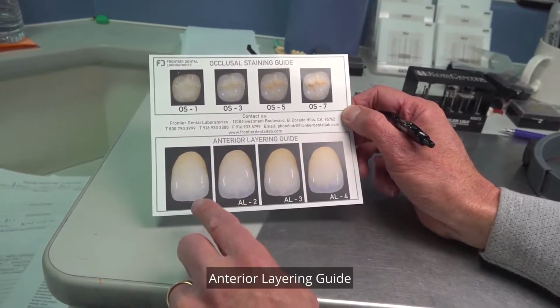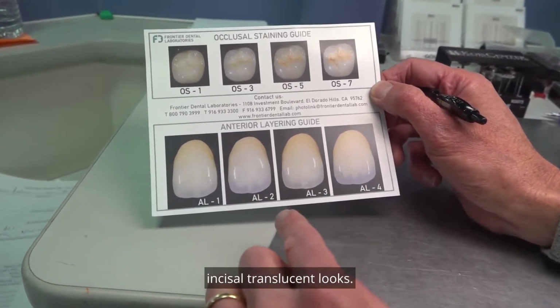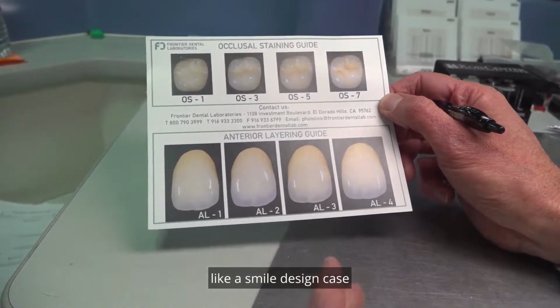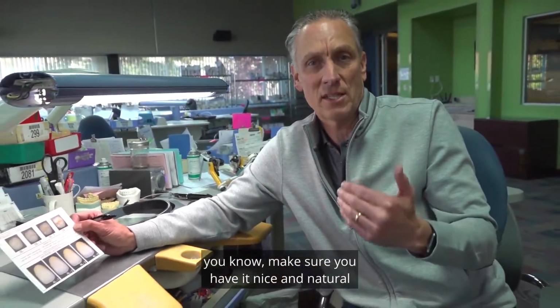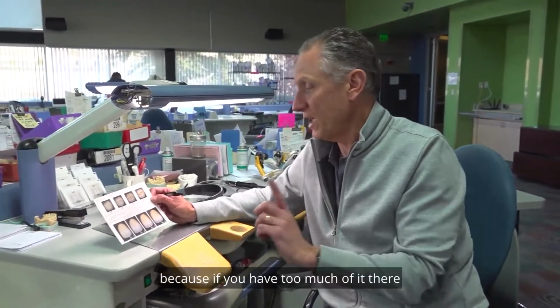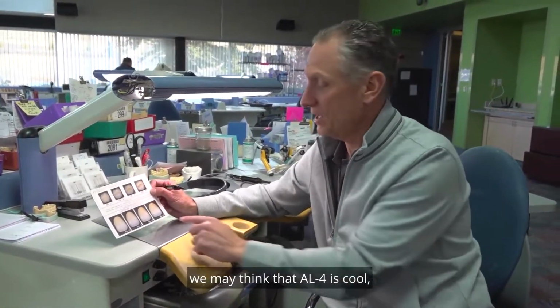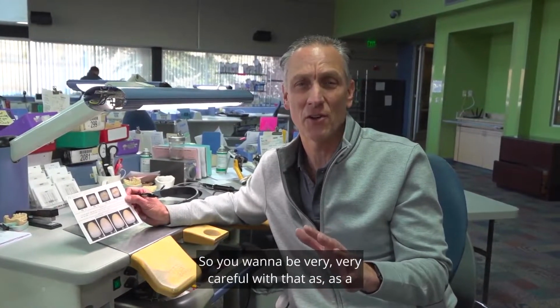The other thing too, on the anterior layering guide, we've got different types of look and incisal translucent looks, especially if it's going to be like a smile design case. If it's a smile design case here, you want to make sure you have it nice and natural because it's all layered in. But you have to be a little bit careful on this stuff because if you have too much of it there, we may think that AL4 is cool. The patient may not think it's cool. So you want to be very, very careful with that.